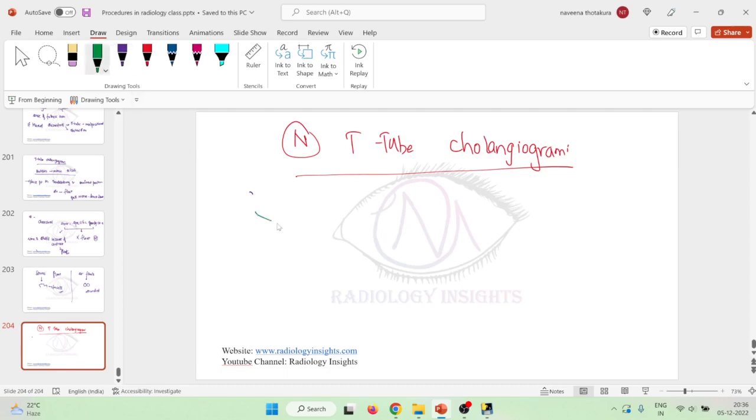What is actually happening is this is the hepatic duct, then you have the gallbladder, common bile duct, right hepatic duct, left hepatic duct. This is the hepatic duct, this is the bile duct, this is the common bile duct.